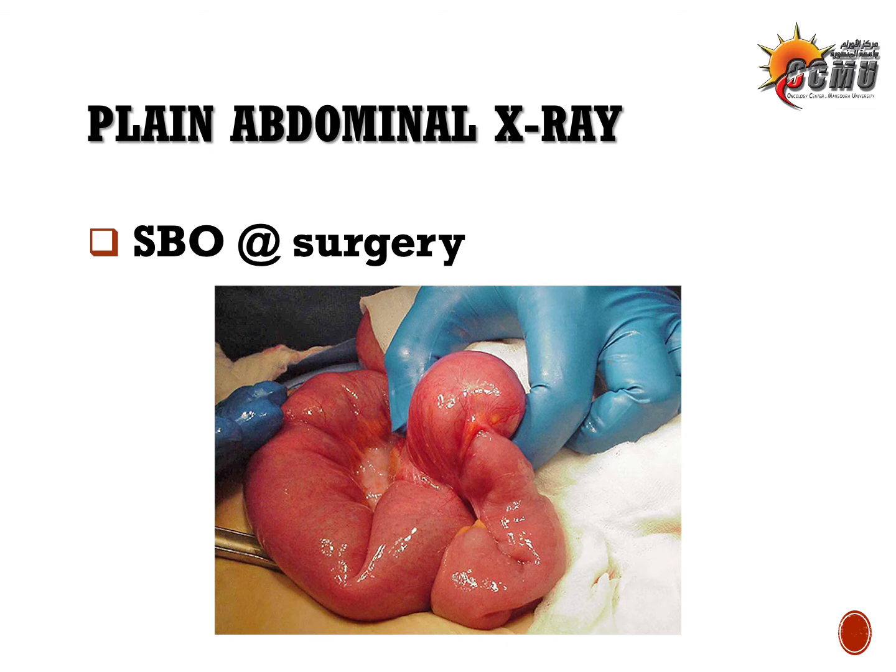When there is small intestinal obstruction, let's consider this look intraoperative. The surgeon's hands are at the site of obstruction. Proximal to the obstruction, the small bowel is dilated, distended and filled with air, and distal to it, the small bowel is collapsed and empty. And that is what we see intraoperatively. But before that, we can expect the small bowel obstruction with the following views.